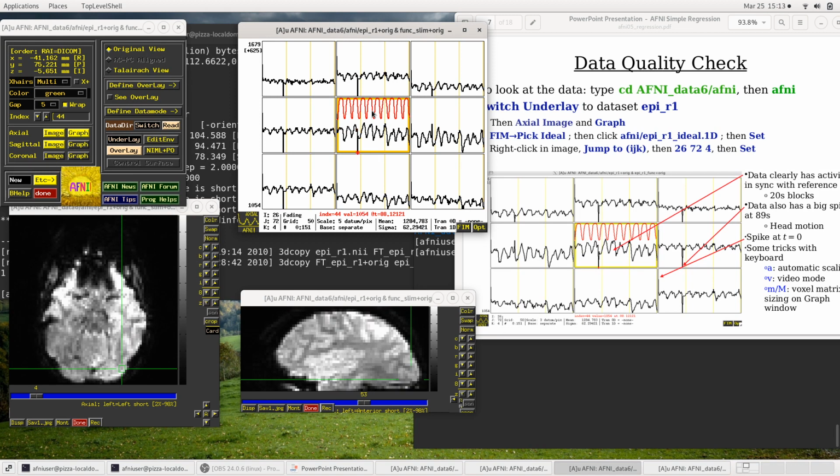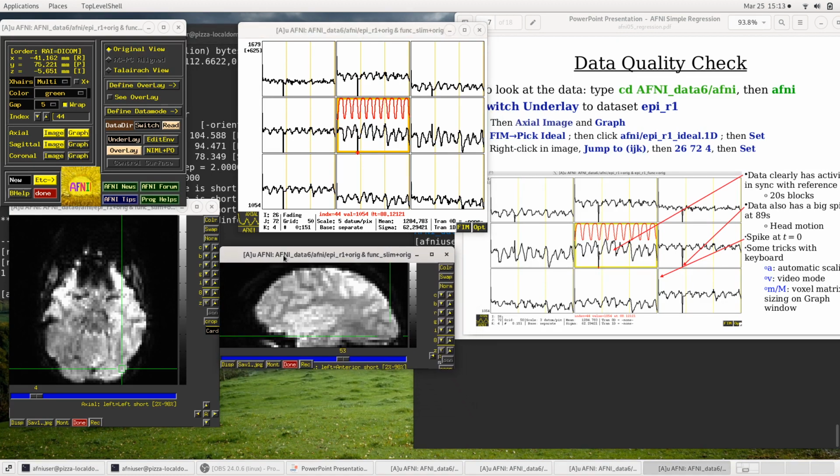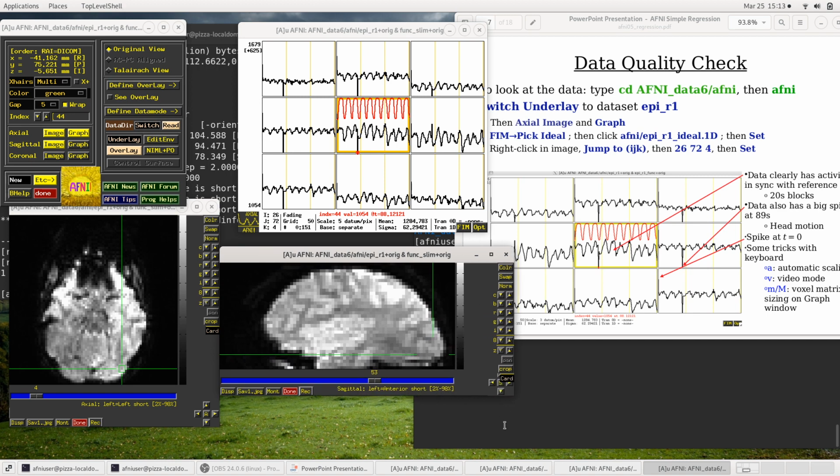And in fact, with this fake data, the subject didn't actually move. They were too good, and we didn't want such a good subject for the class, so we had to fix that up too. We faked a little bit of head motion, so we added a 2-degree rotation for that volume. But anyway, you see approximately what would be a typical effect of head motion here. And again, you don't see the striping because we faked it. And adding striping would be entirely too much work.